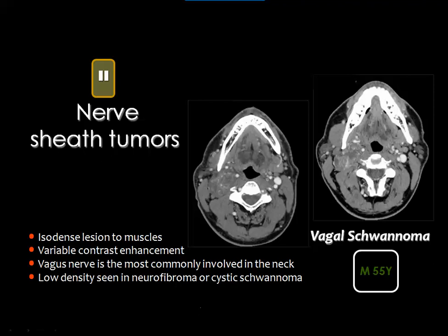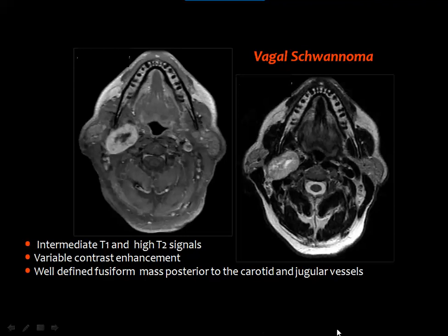the enlarged lymph nodes. Then schwannomas, you know the criteria of having a cystic component, and they usually have central areas of breakdown. They do not have a strong enhancement similar to the vascular tumors.